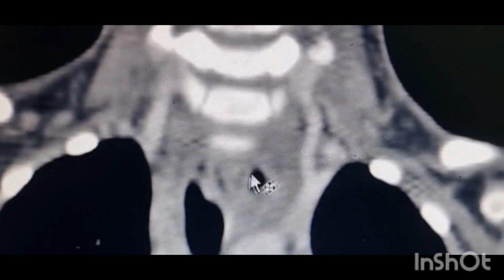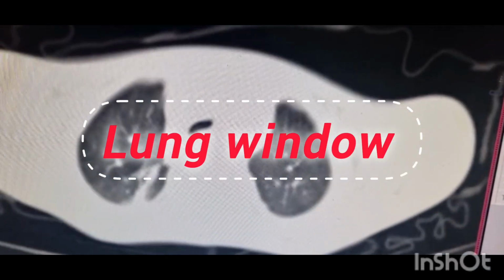As we see here, this is the air foci in the soft tissue in between the trachea and esophagus that causes the clinical symptoms in this 2-year-old patient who doesn't eat properly and has been regurgitating food for 3 months. Now let's see the lung window of this patient.